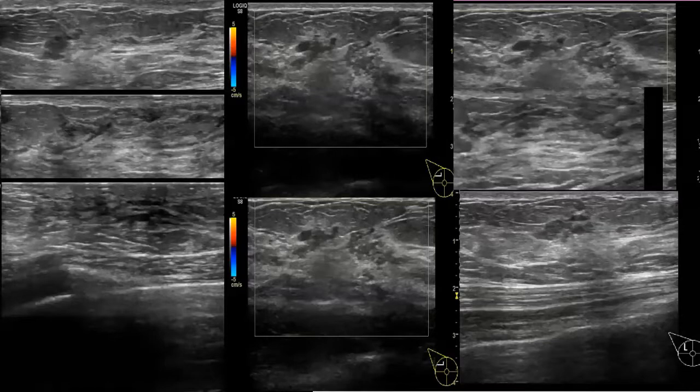Excellent. So this is ultrasound. The ultrasound shows microcysts, I think, associated with the area of architectural distortion. Where is the cyst? You mean here, this is ductectasia. But I mean in the upper, this is soft tissue.